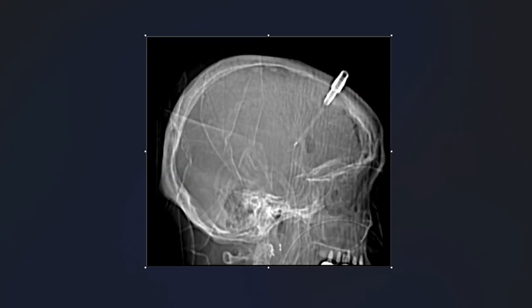And so it's not a very exciting or case report worthy case, but it's certainly something good to train your eye to look for abnormal lucencies on something just like a scout radiograph. And that's a takeaway for a certain type of exam that likes to make sure you really know what you're looking at, including on different modalities.